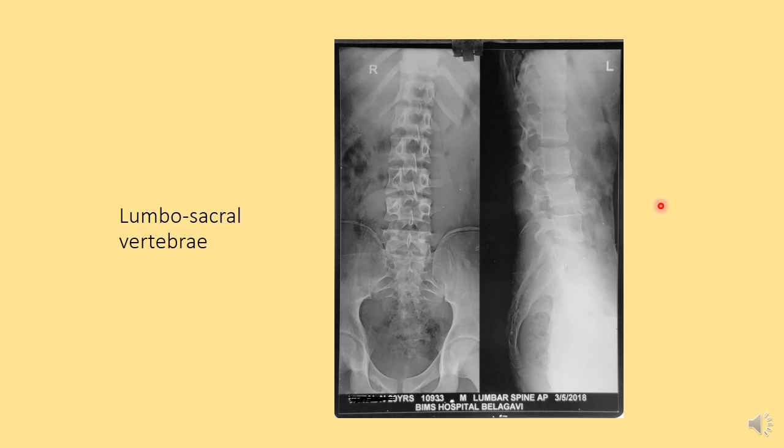So such exposures are also known as KUB exposures. They are simple X-rays. We are looking at some stones without preparing the body, directly exposing the person under rays. This is a simple radiograph of KUB you can also call, but the area of interest is the lumbar region and sacral region. We can also call it a lumbosacral X-ray, AP and lateral view.